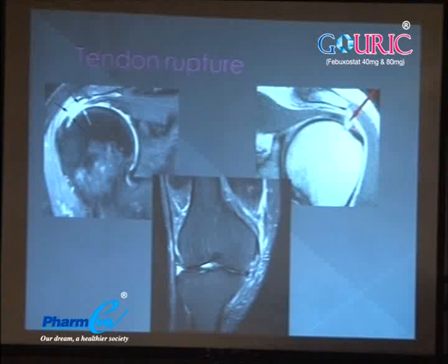Enough because you see this high signal area in there. That's the medial collateral ligament, and you see that high signal area with disruption of the ligaments over here.